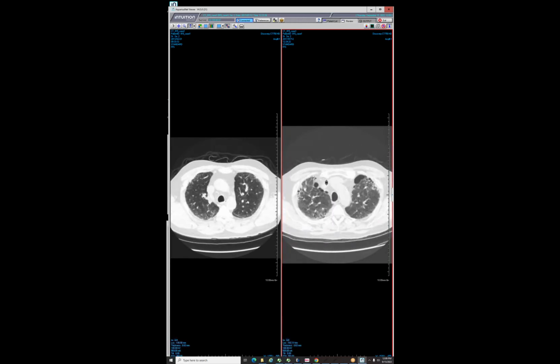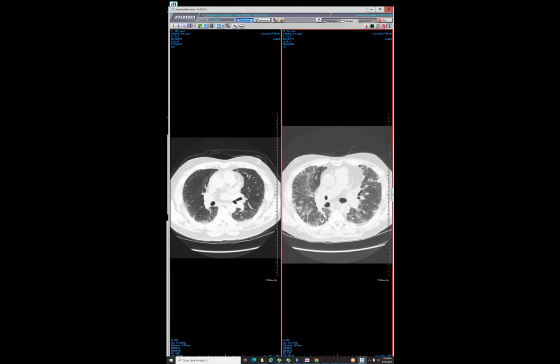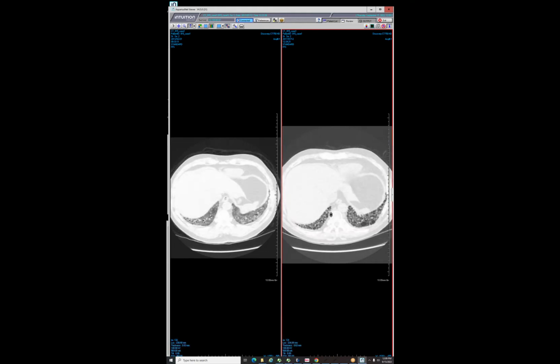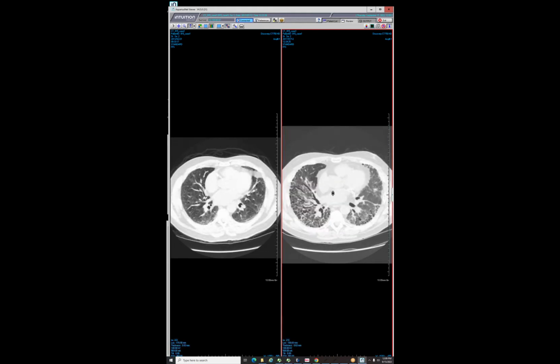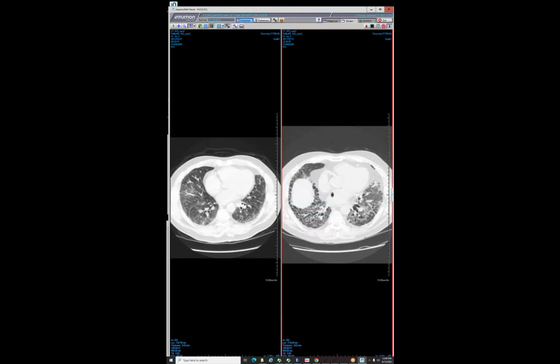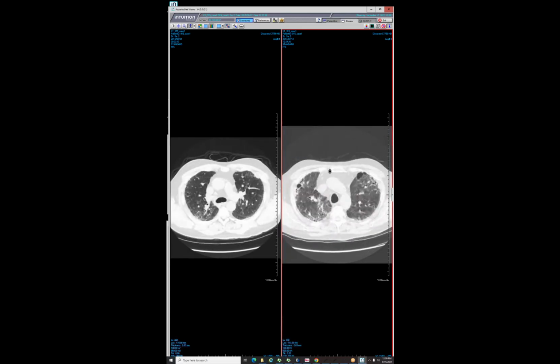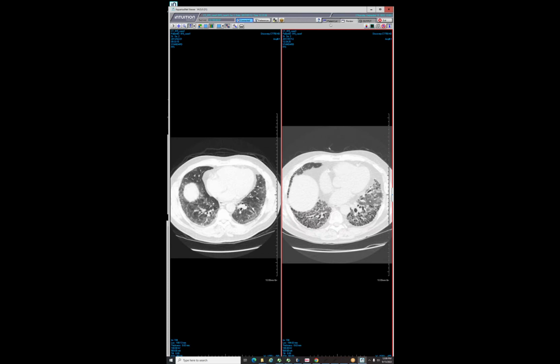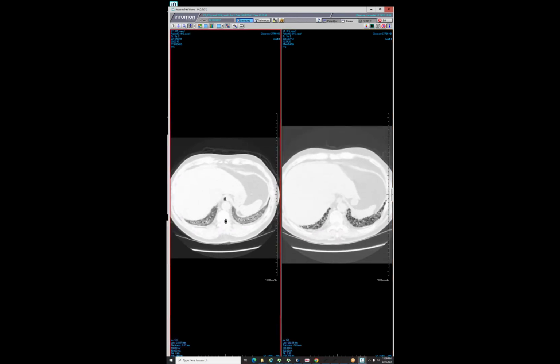Yeah, for these cases now, I just don't even designate. I just say in keeping with their known connective tissue disease. Right. Oh yeah, see, I would say UIP pattern due to connective tissue disease. But yeah, anyways, it's a semantic thing, but we all seem to be imprisoned by it, enthralled by it.